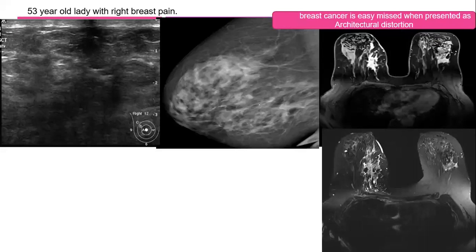Then we proceeded to MRI. If you look at the MRI, this is T2, demonstrating distortion and hyperintensity, an edematous breast extending from the prepectoral region down to the nipple, with ducts, you see here, associated in a segmental pattern and adjacent skin thickening, even here, and the skin thickening is enhanced.